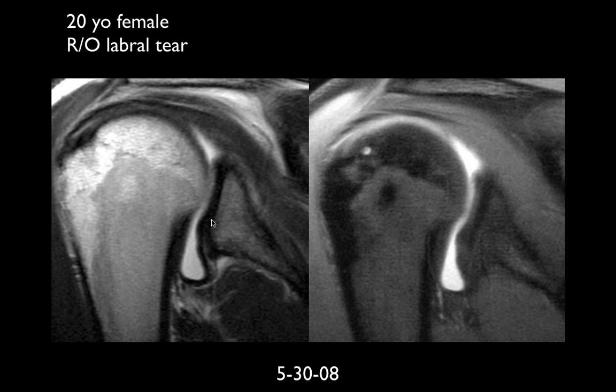Now notice the subchondral bone here and how typically the margins of the glenoid all the way around should be quite prominent, because the margins of the glenoid are really the bony buttress which adds stability to the shoulder. So when you see the margin blunted like this, we saw it when we talked about retroversion of the glenoid, which is highly associated with posterior instability.